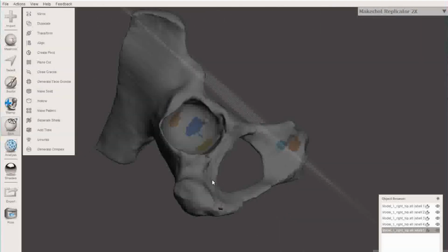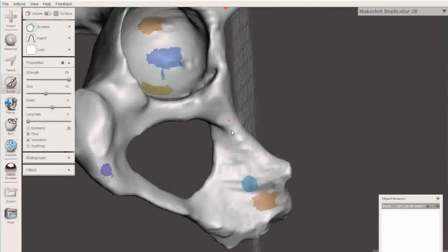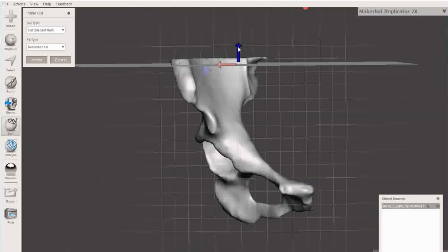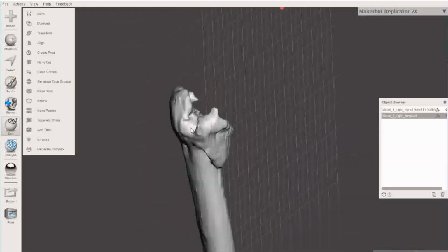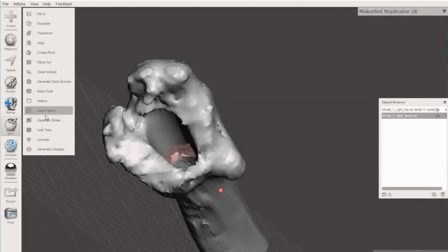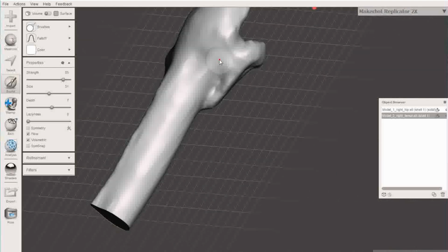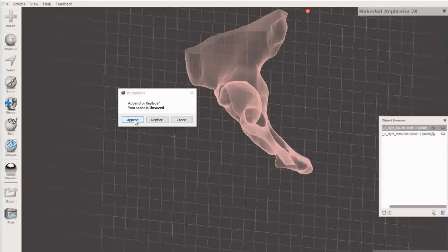When post-modeling, it is very helpful to know which 3D printing technique will be used to produce the model. If you are going to use a resin-based 3D printer, you must follow other design guidelines than when using FDM-based printers. In this specific case, we decided to use a basic FDM 3D printer, meaning we have to simplify the model as much as possible without changing the relevant anatomical structures. This will later help to reduce the overall print time of the model. It will also minimize the risk of failing prints.